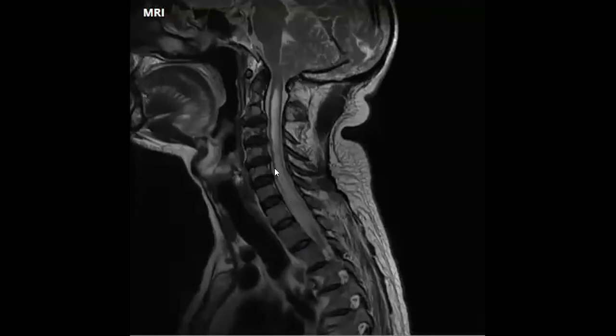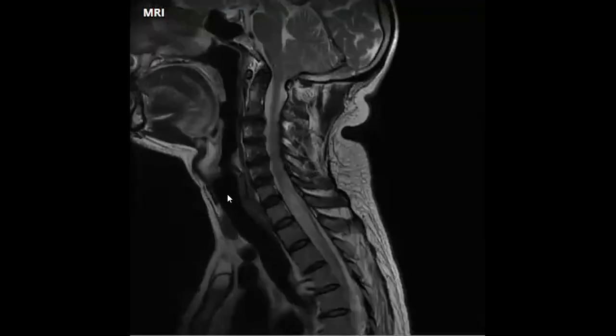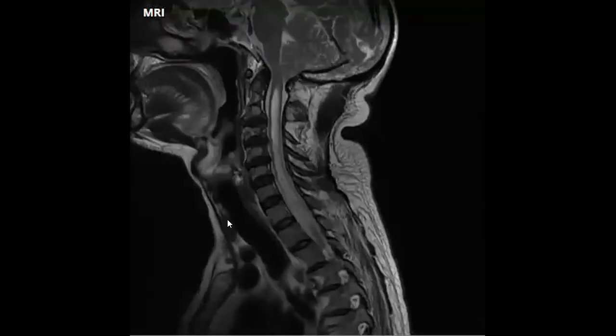If you find syringomyelia, go check for the herniation. When you find the herniation, go check for the syringomyelia. And if you find both and the patient is an adult, go check for the Charcot. So the rule is, when you find Charcot, especially in the shoulder, try to check for the presence of something like a cervical lesion that may be affecting the neuropathic pathway for the shoulder. And this is a good case.